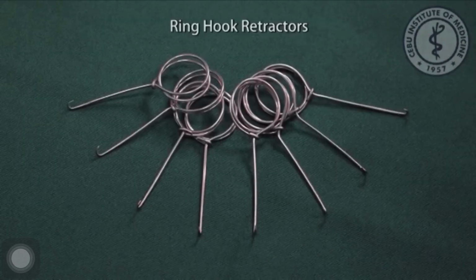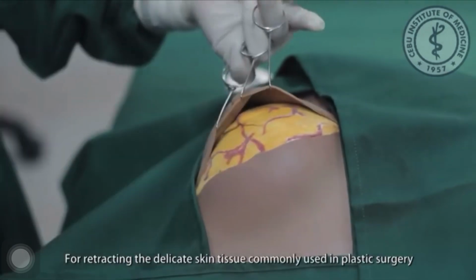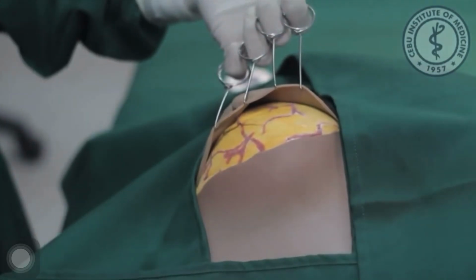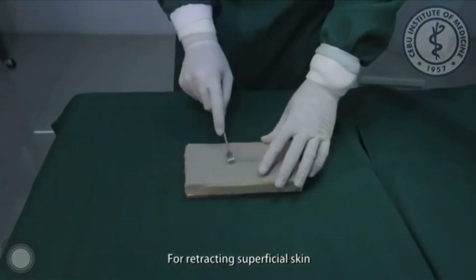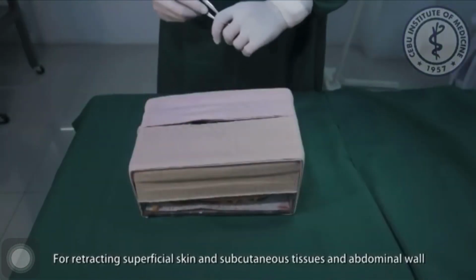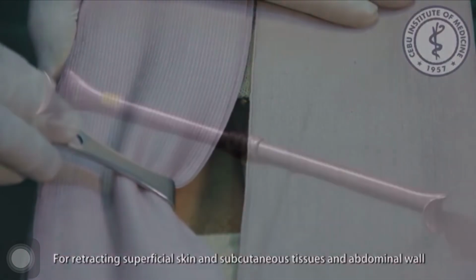Retractors. Ring hook retractors, for retracting delicate skin tissue, commonly used in plastic surgery. Matthews or Senn retractor, for retracting superficial skin. Army-Navy retractor, for retracting superficial skin and subcutaneous tissues and abdominal wall.